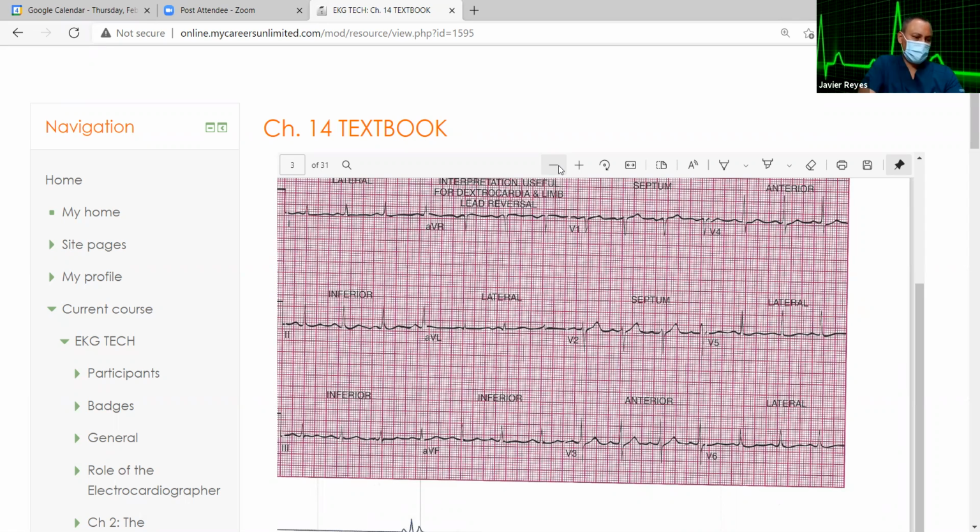It's deep S, and then it goes back up and there's a T wave. I don't think there's much abnormal. The T is facing the right direction, has positive deflection, and it's above the isoelectric line. So V2, not so much. V3, you said? V3 looks pretty normal to me.